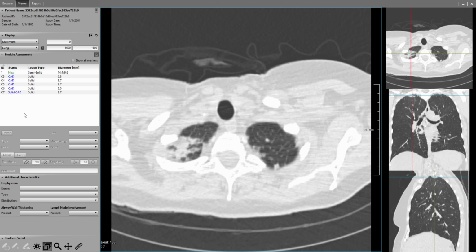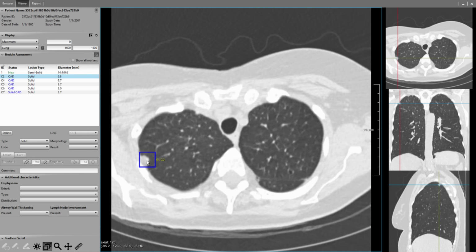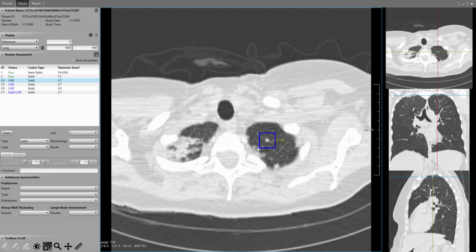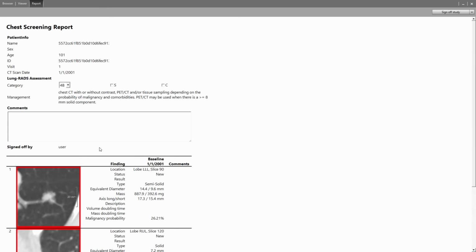This was this other lesion, which I think is nothing, and apart from that, there's a small nodule here. That's not that suspicious, and the other things are again something in the upper lobe. This is a nodule, but a very small one. So this is the suspicious lesion in this case.